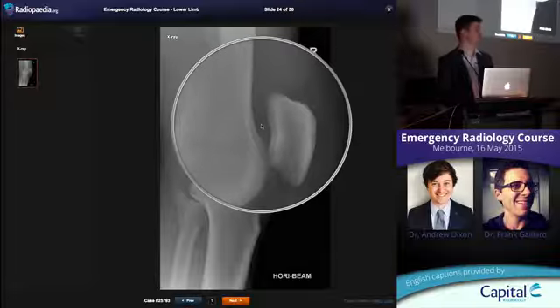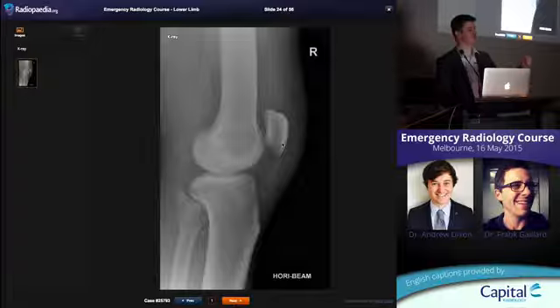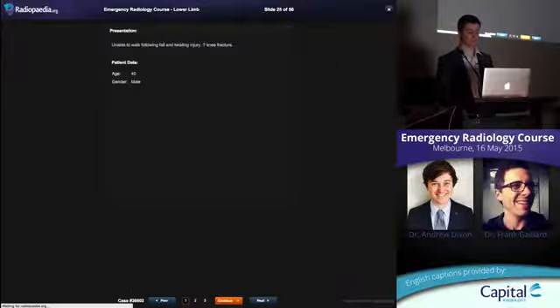They've not actually got a joint effusion. Clinically, some people can get confused. I think as a radiologist or as someone interpreting this, it's actually important to put that in your report, okay? Because we'll often report this as there's no knee joint effusion, no fracture or malalignment, but I think it's worth saying there is significant prepatellar soft tissue swelling consistent with prepatellar hematoma in this setting, okay? If it was in a different setting, you might say prepatellar bursitis, okay? Important to mention that because otherwise the clinician's going, oh, why is he so swollen if there's no joint effusion? Helps them understand different spaces.